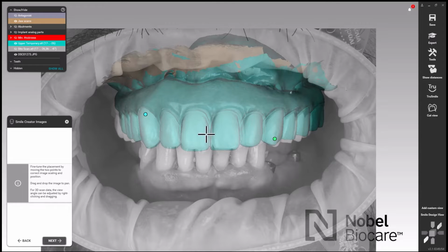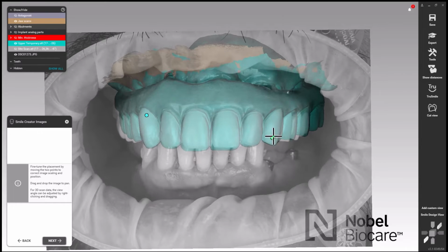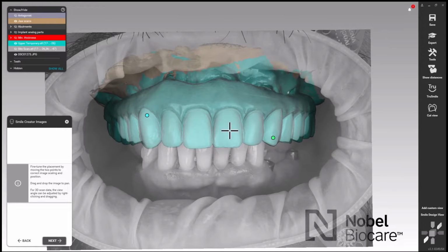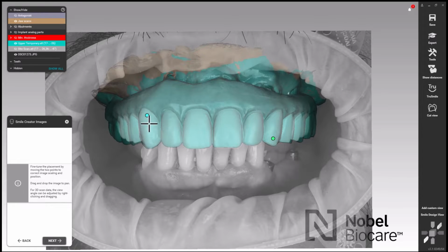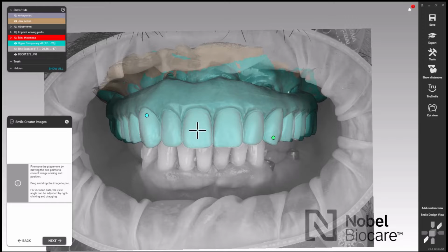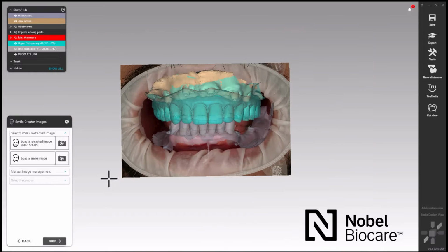And we start to now manipulate to match the model with the scan. By holding the dots, you can actually stretch and pull and make it wider, softer. Or if you click on your model with your mouse, you can move the model as well. So you can move the picture, or you can move the model just so you can get really nice alignment. And I do spend a little bit of time. I typically make sure my 6 to 11 is perfectly aligned.